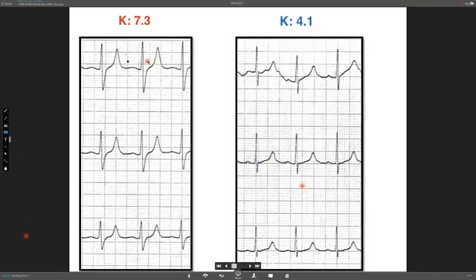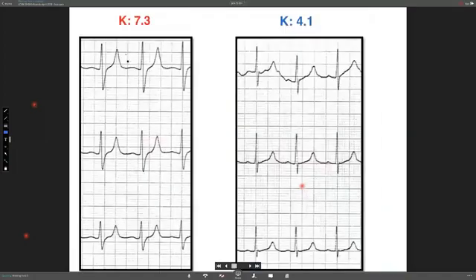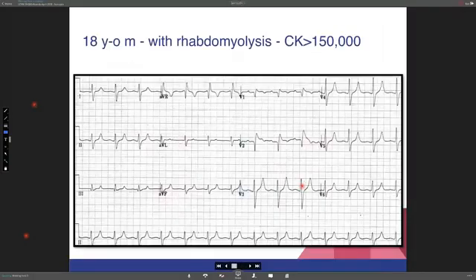No, and then there's another mouse, another one. So the last thing I'd like to comment about in this case, if we go back to this EKG, I don't know which mouse is this, Khalid. Might be one of the other screens, because you have two desktops. Right, so maybe somebody else, sure.